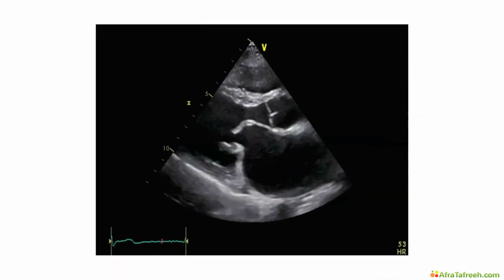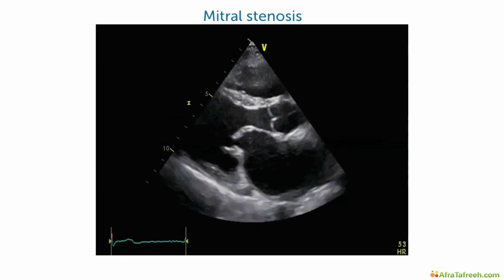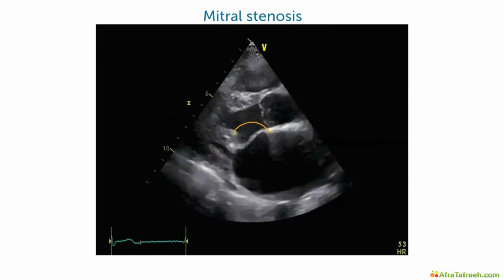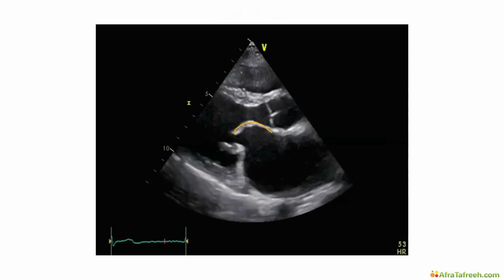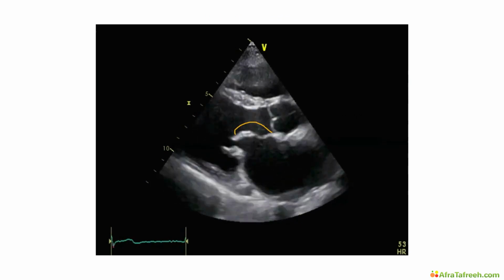Exactly, and here we have a really nice example of mitral stenosis, where with this awkward motion of the anterior leaflet, we will call it later on in the chapter on mitral stenosis, doming of the leaflet, and as soon as we see it, we can really understand the mitral stenosis is there. But again, don't worry about that now. Just keep in mind that if you have a valve which has a pathology such as this, it can also be incompetent.